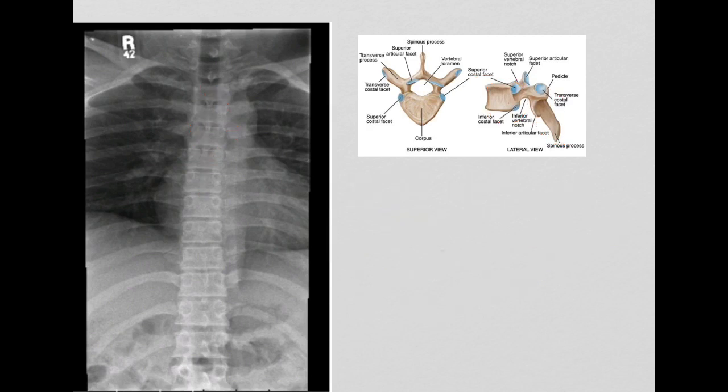All right, so we've gone over pedicles. We have gone over pedicles on the superior view. We have gone over spinous processes. You will also notice transverse processes out to the side here. Okay, very good. And of course we know that these are posterior ribs because of the direction they're going. If they were anterior ribs, they would be going more this direction.